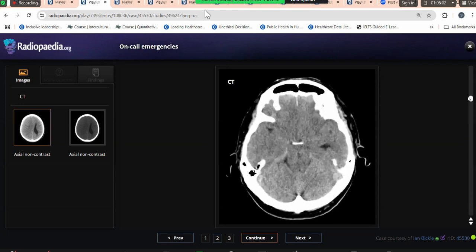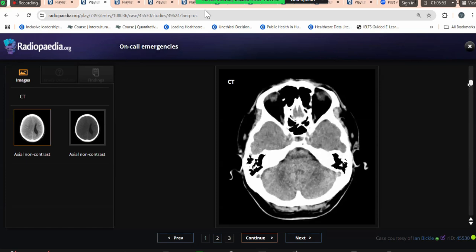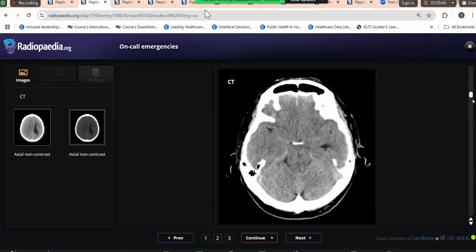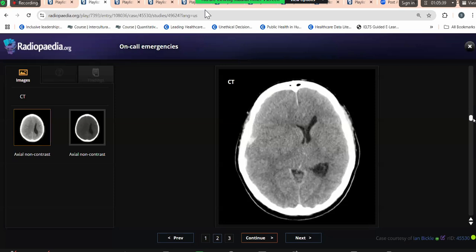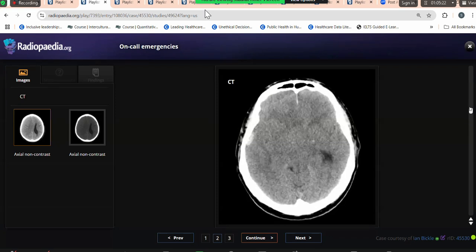As I scroll inferiorly, there is non-visualization of the ipsilateral temporal horn as well. The contralateral cerebral hemisphere and also the bilateral cerebellar hemispheres look unremarkable. So a large isodense area. I would review the clinical notes for this patient. I can also appreciate an ill-defined hyperdensity in the right frontal region as well, which is causing compression on the temporal lobe, causing effacement of the Sylvian fissure.